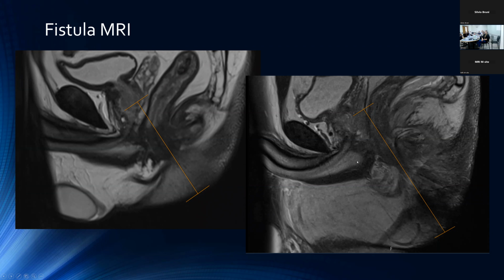So on the right here, again, we're roughly midline on this image. The anal canal is kind of distorted in this case because of quite extensive acute on chronic fistulizing disease. But again, best approximating what you can see to be a distorted anal canal here, extending several centimeters above that anorectal junction superiorly, and then through the mid portion of that inferior anal verge.